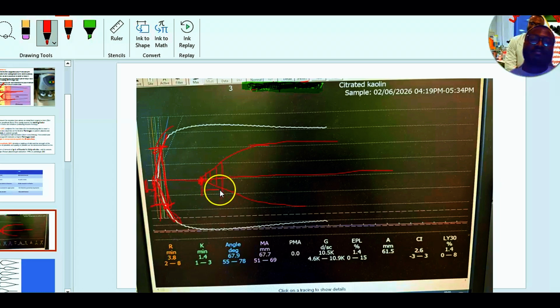The K. So K will be this time, whilst the R will be the start time till we have this initiation. And from here we will trap more platelets into it and fibrinogen interconnection until we get to the widest clot that it can form.